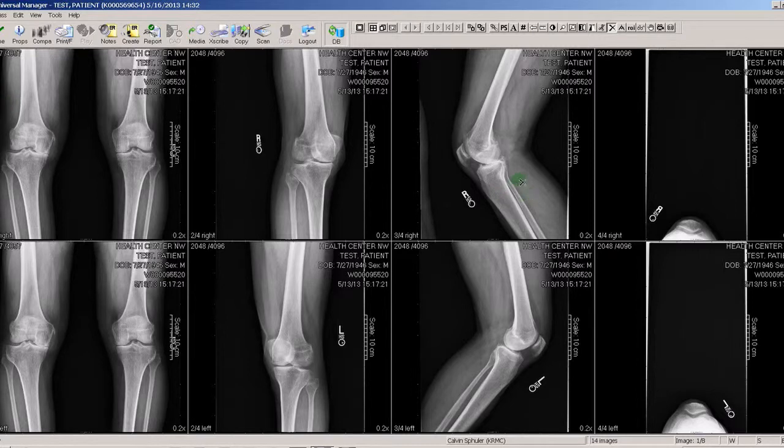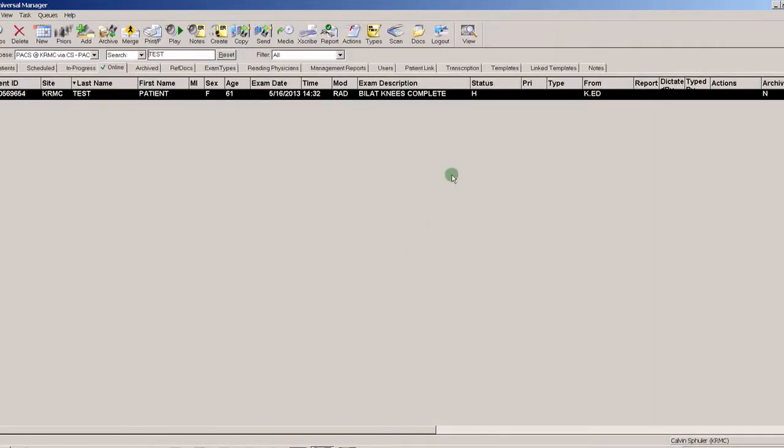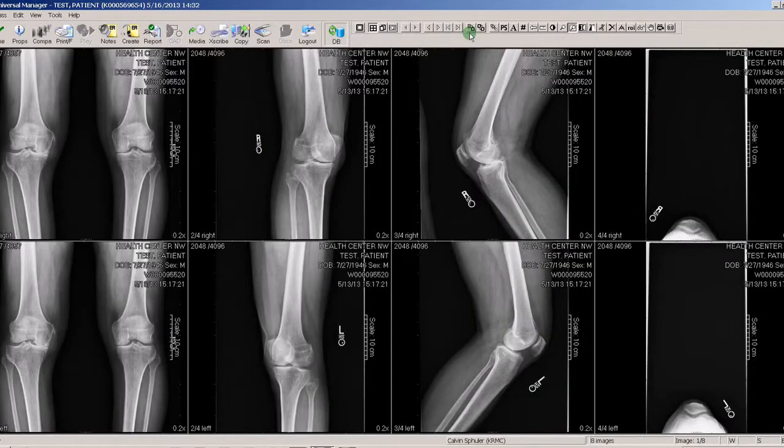At this point, once you have all the correct images in the series, you can go ahead and crop and then window and level and label appropriately. After that is finished, go ahead and click Done. Save your changes. And then you may just want to double check that everything's correct. So if you go ahead and do 8, that gives you each series on display.